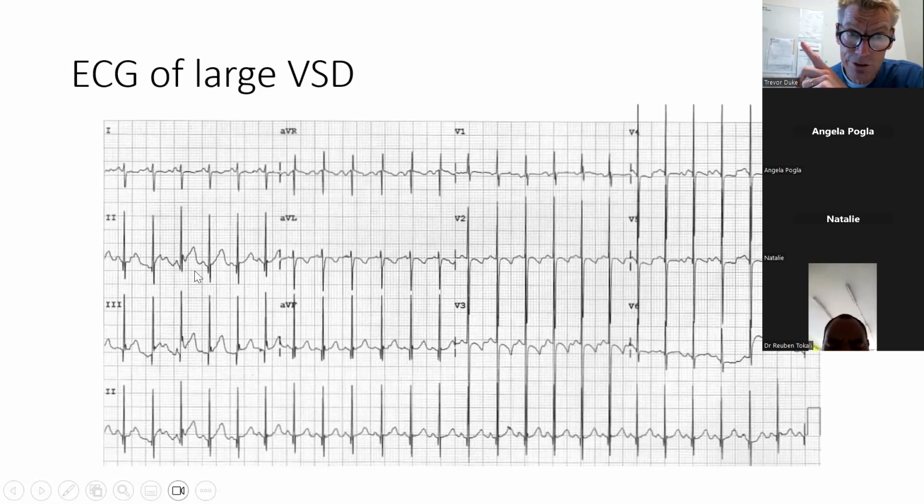The second thing we said for it to be sinus rhythm is that there has to be a P wave before every QRS complex. You can see on the rhythm strip here a consistent P wave before every QRS complex, and the PR interval is normal between every QRS complex. So far we know this is in sinus rhythm, with a heart rate close to 150.